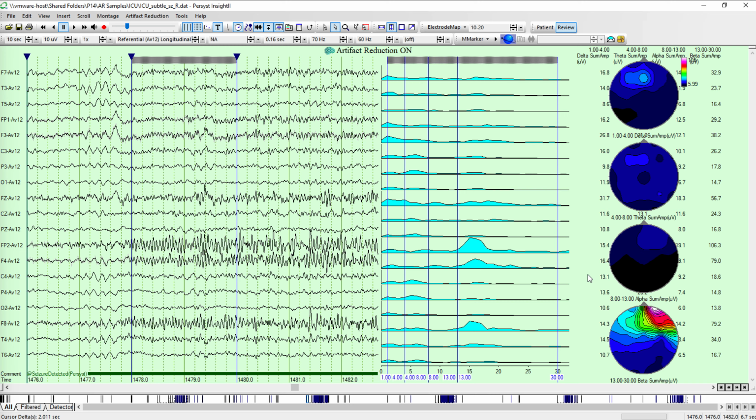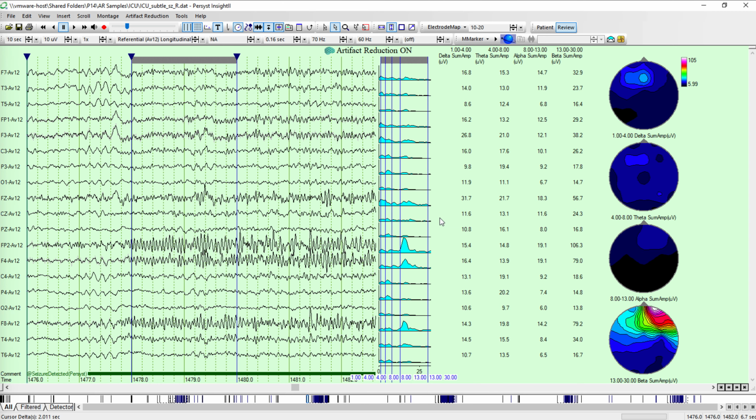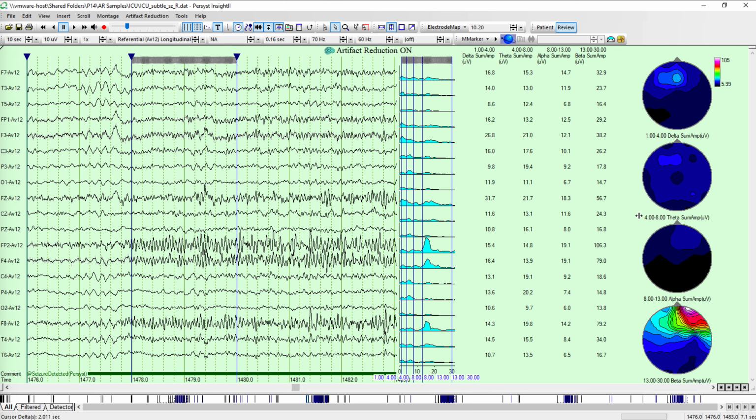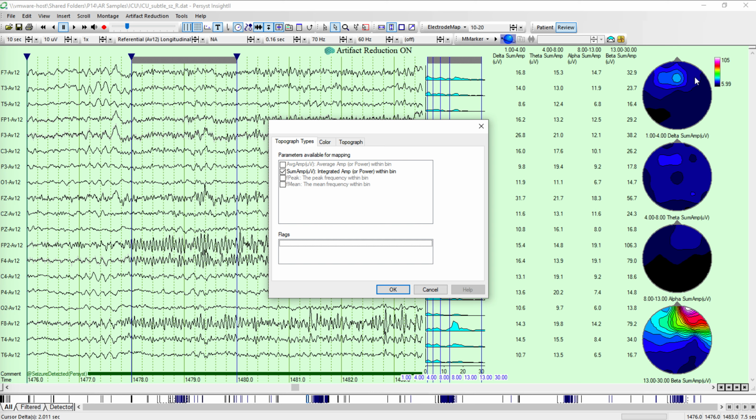So right-click, insert topograph, and it's laying it over top of these, and we can make this a little bit different layout by just moving our mouse till it becomes a two-headed arrow, and then we can move things left or right and position them as we like. Now for the map, let's change the map a little bit. This is using what we call an RGB cube color palette, and so the colors get brighter as you go higher up. Not a bad one.